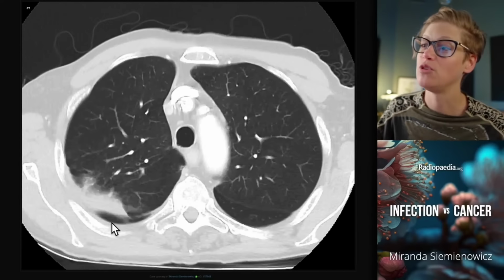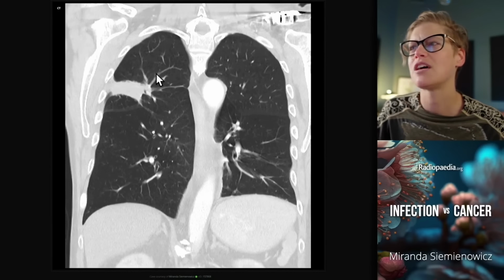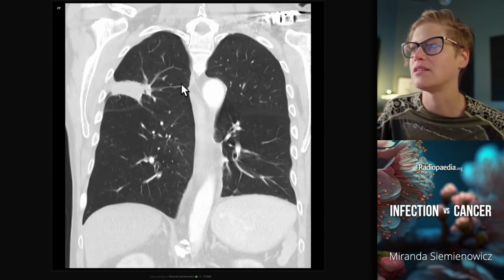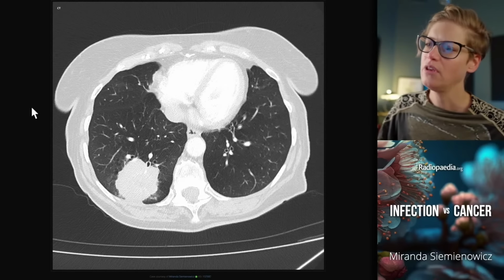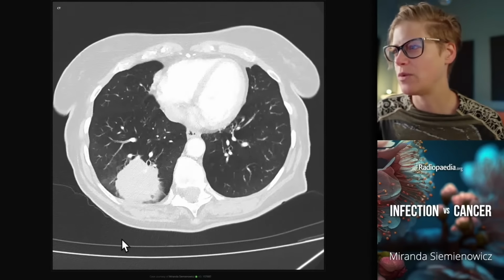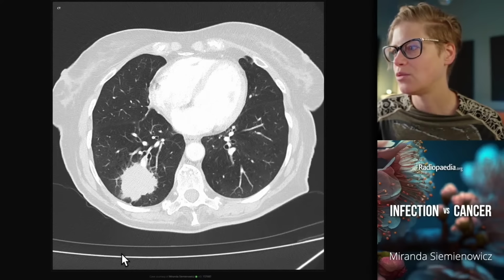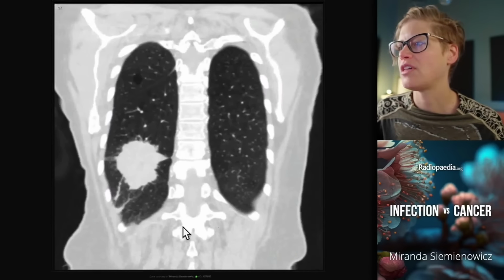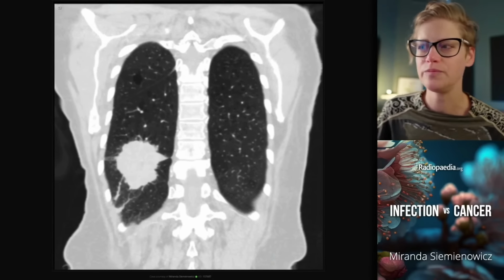Let's go back to our beautiful scalloped case from earlier, just to show you on the coronal once again, just how much wider than tall this is. So this is the shape of a benign lesion, proportions in the lung. That's as opposed to this obvious cancer in the right lower lobe. Nobody would have any trouble picking that. It's got a lovely microlobulated margin all the way around. But I'm just putting this here to show you that the shape of a cancer is a ball.